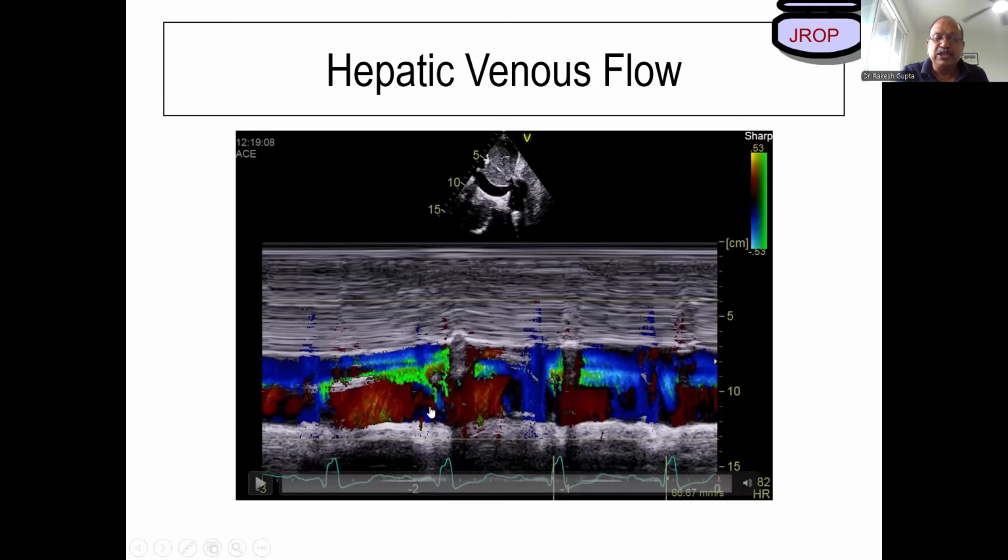But here, there's no constriction. You see a reversal of flow in all systoles, 1, 2, 3 and 4. They could be a little variable because of the respiratory process, but they are seen virtually in all subjects, all leads. Clear? So this signifies the severity of TR, sir. Correct.